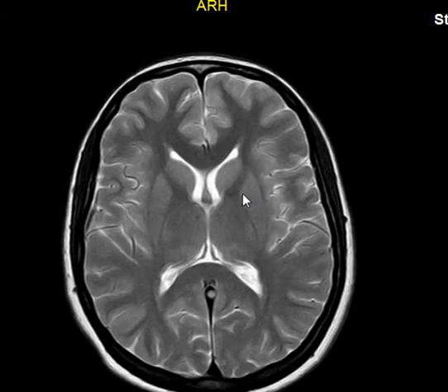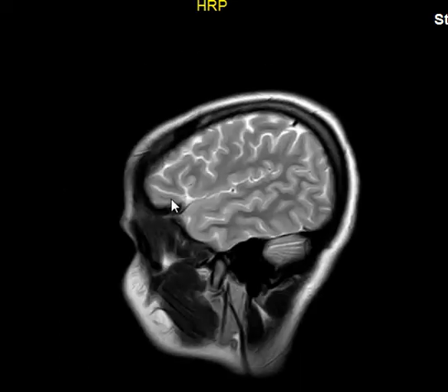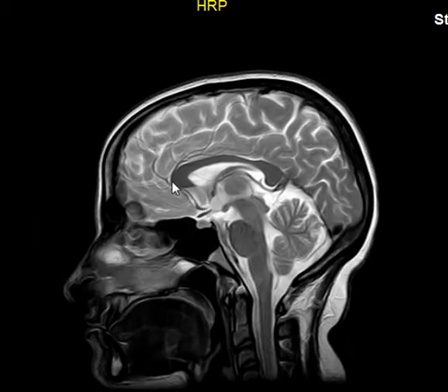Regarding the corpus callosum, we talked about it in the last session last week. Just fast notes: it is a bunch of wires of fiber, neuron dendrites and axons and things like that, connecting the right and left cerebral hemispheres. It is the biggest commissure, exactly in the midline, composed of rostrum, genu, body, and splenium, connecting the right and left side.